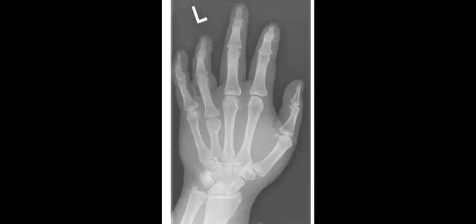Gorlin syndrome. Yes. So you will search for dural calcification. It can also be idiopathic, maybe infection as well. Sickle cell disease, maybe polydactyly. Trauma, infection, perfect.